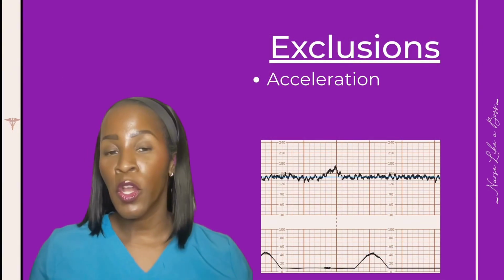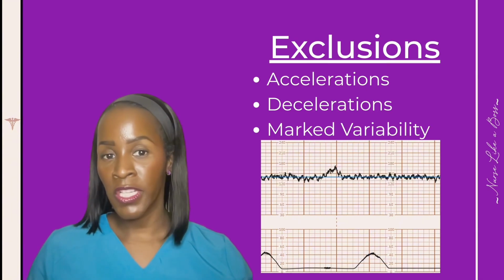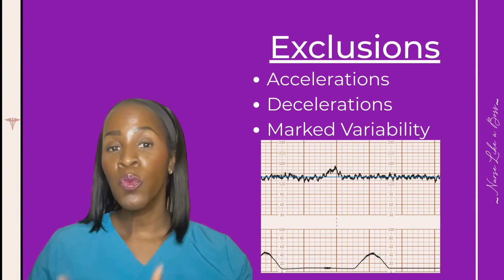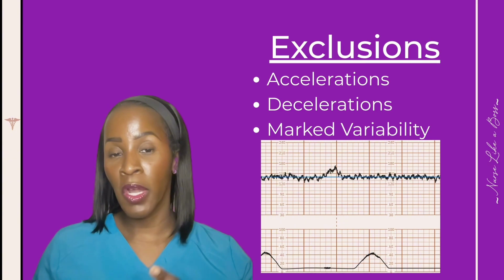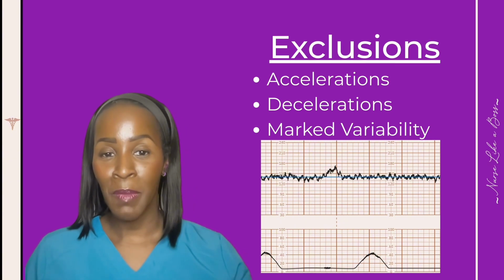When obtaining your fetal heart rate baseline, you want to exclude accelerations, decelerations, and marked variability. Now, we will go over these in separate videos. However, I will touch on them so that we can make sure that you are comfortable and confident when obtaining your baseline in this module.